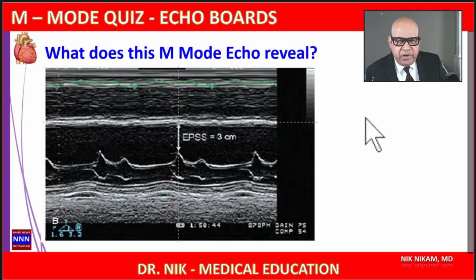As I said, I don't want to give you multiple choice questions. I want you to independently think and analyze each structure from the beginning with the EKG and write down everything that you see abnormal. I mean, that is how I teach students, residents and fellows electrocardiography. I give them a copy of a normal electrocardiogram and I say, does this look like a normal electrocardiogram? Yes or no? No? Then what is different from the normal electrocardiogram, and where is the difference, and how is the difference?